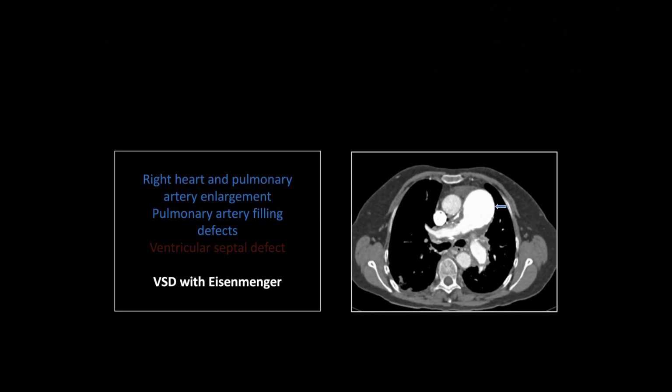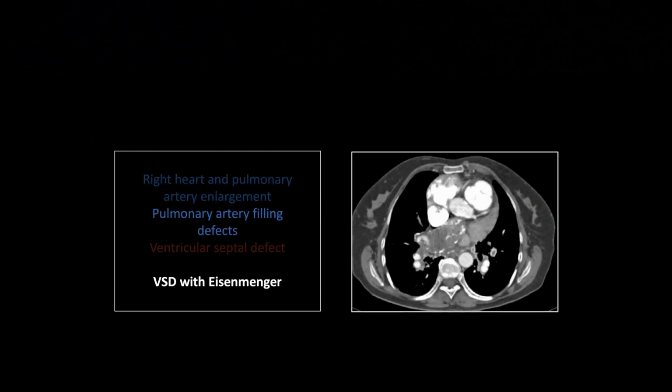It's intense. There's peripheral calcification of the PA, which is a sign of chronic extreme pulmonary hypertension. And there is that thickening, chronic looking, really it's organized thrombus lining both of the pulmonary arteries. And that right pulmonary artery, you can see that beautifully there. Right, so that is really long-standing, very extreme chronic pulmonary hypertension.